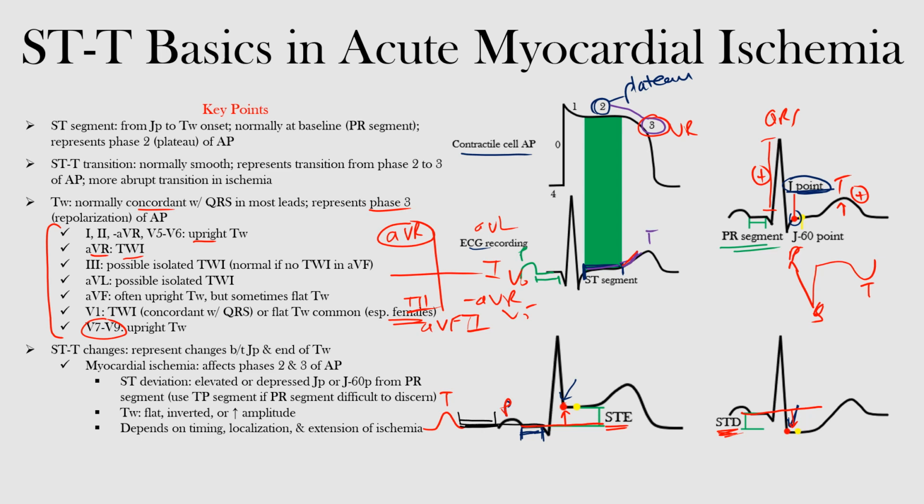Now, what we use today is the PR segment. You'll hear a lot of people say otherwise, but recent studies have suggested that the PR segment should be used, okay? And there's many reasons around that that we won't get into.